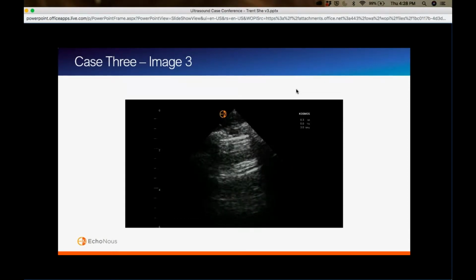And to answer the first part of the question, is it common to see some bubbling in the ventricles during CPR? I definitely have seen some material pass, especially if you're infusing agents into the right ventricle. But I think it's less so the infusion in the right ventricle and more so the fact that the RV is pretty dilated on that initial cardiac view that leads you down all of this entire pathway.